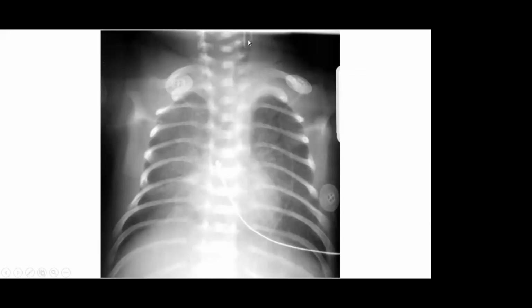Okay, here the ET tube is completely above. This is again on the right side. There's a rotated X-ray also simultaneously. The tip has practically gone way above. So this is not a right placement. Maybe the tip has not even reached the glottis.